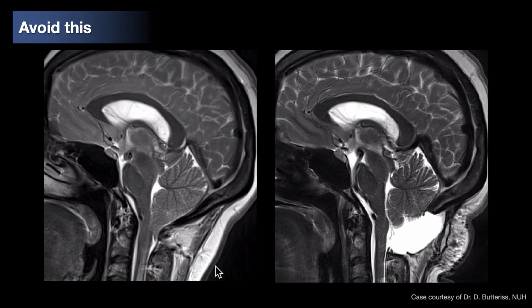So this was a patient who presented with headaches. The neurosurgeons did not get their radiologist to review the case, and they went ahead and did a foramen magnum decompression thinking it was a Chiari malformation. Now they're coming back to say the patient is still symptomatic. Why? Well, the post-operative imaging shows the same as the preoperative imaging. The pituitary gland convexity, hyperemia. The brainstem looks as though it's been distorted, that midbrain sagging backwards. The floor of the third ventricle is downsloping, the venous sinus distension. This patient has SIH and they need management of that.